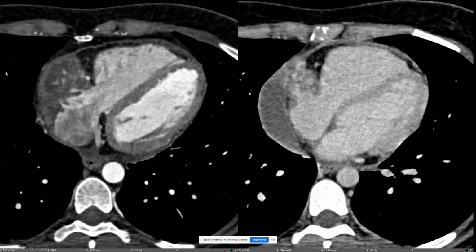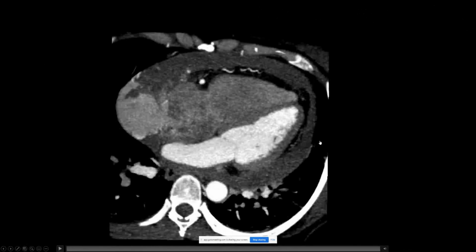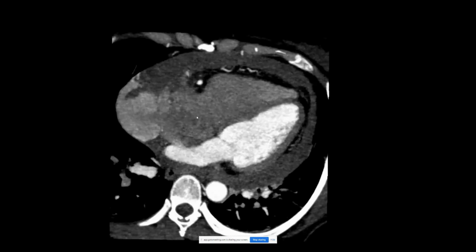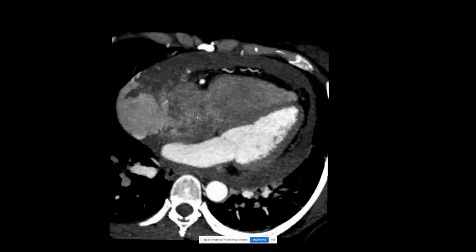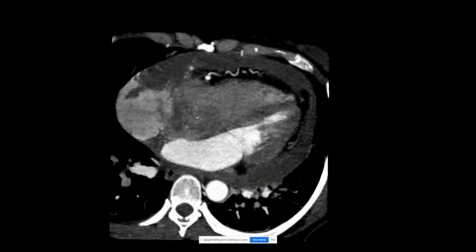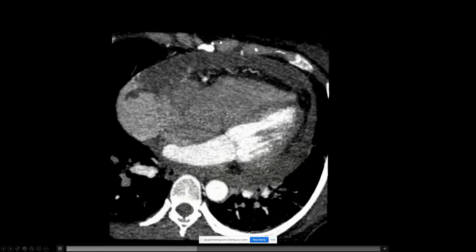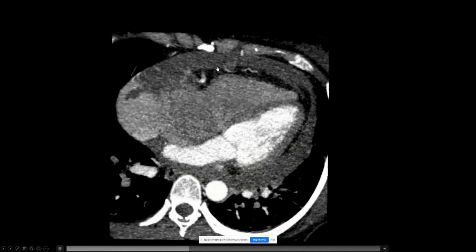I've had 2 cases now like this that we've seen that look hypervascular. And of course, if you go back, it's peripheral nodular discontinuous enhancement that follows blood pool, right? If you put this in the liver, nobody would blink and say, oh yeah, that's hemangioma. It's amazing to me, you put it there and all of a sudden we're all kind of throwing up our hands and suggesting more advanced imaging.